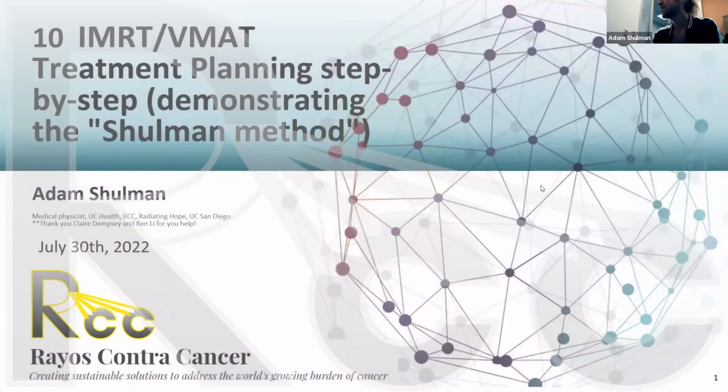Going to cover, I think, a lot of helpful information today, and I'm really excited about this planning method. The idea is to make the planning as simple for your optimization algorithm as possible and just not have any conflicting arguments. If you follow these simple rules, you should be able to get an almost perfect plan on the first try.